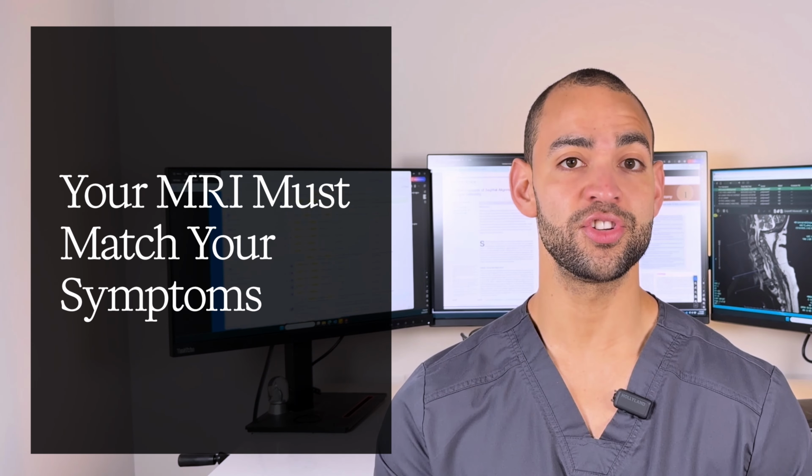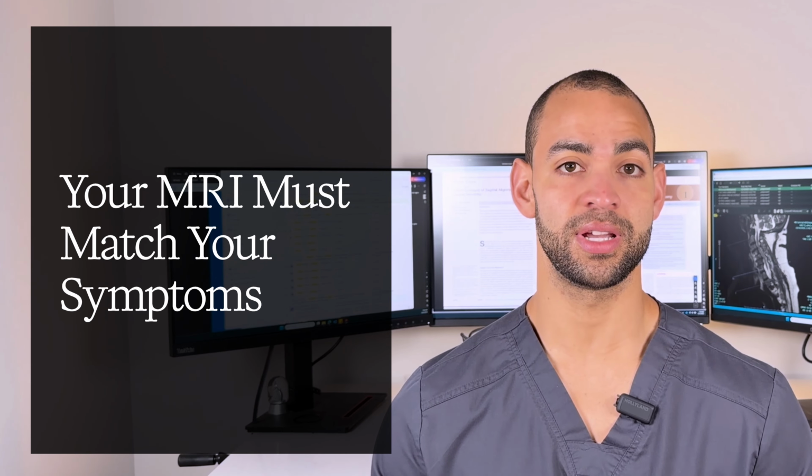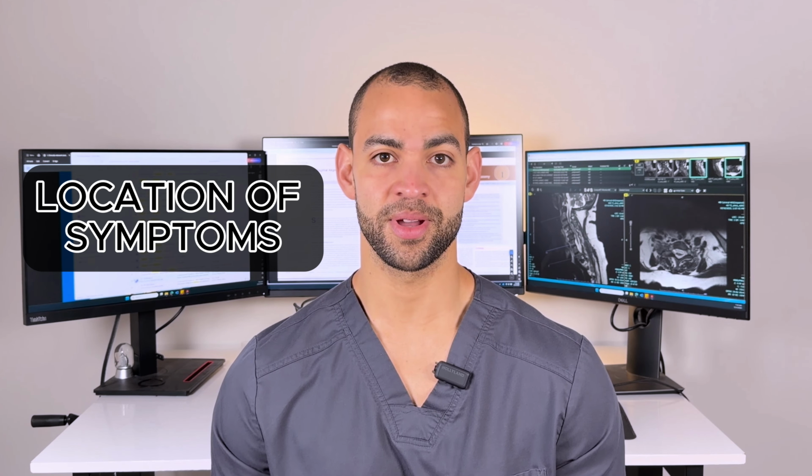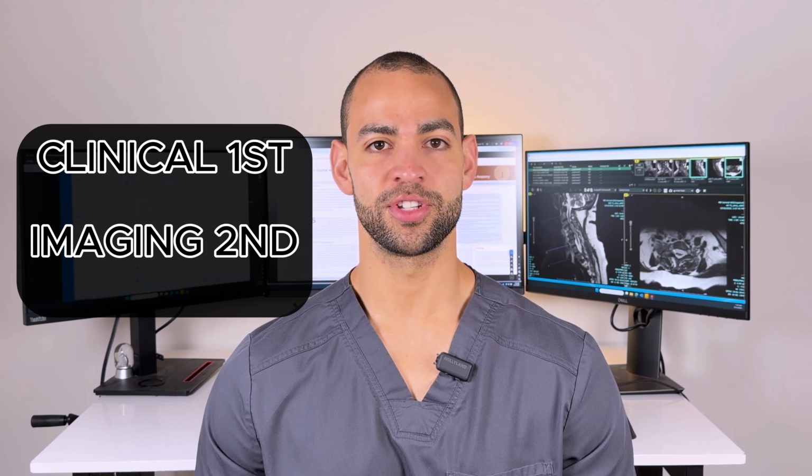Now, when I'm looking at your MRI, I'm doing two things simultaneously. I'm looking at the images and I'm looking at you. I'm asking, where are your symptoms? Which fingers are numb? Which movements are weak? The diagnosis of radiculopathy is clinical first, imaging second. Your MRI might show a disc herniation at C5-6, but if your symptoms are in a C7 distribution, something isn't adding up, and I have to figure out why.